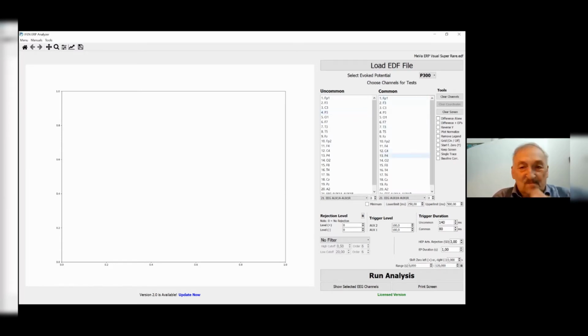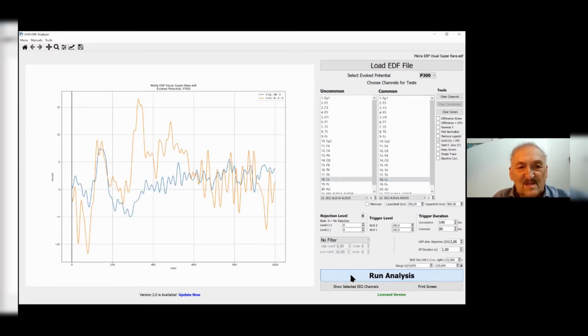To see the ERP, you only have to click on the channel you want to see. Commonly, we first look at CZ, at the central on top, and say run analysis, and then you have the averages of the epochs of the uncommon.